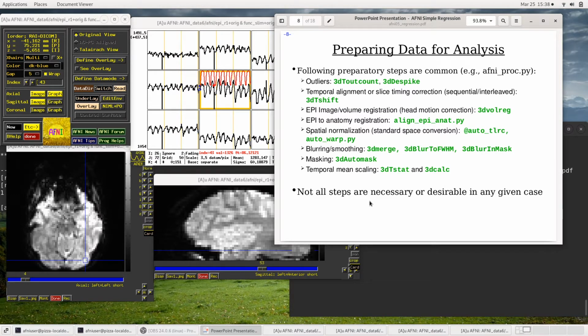With perhaps one of the most initial pre-processing steps being a form of registration, maybe even two-dimensional slice-wise registration. So, back in the day, EPI might have been more commonly acquired as sagittal images because they register better individually than, say, axial ones.